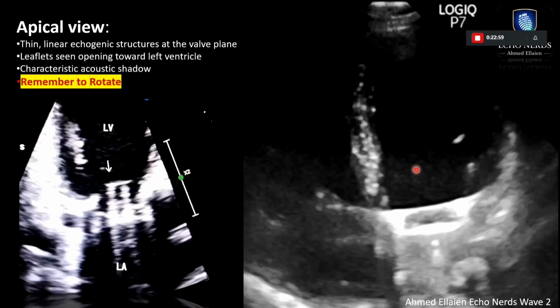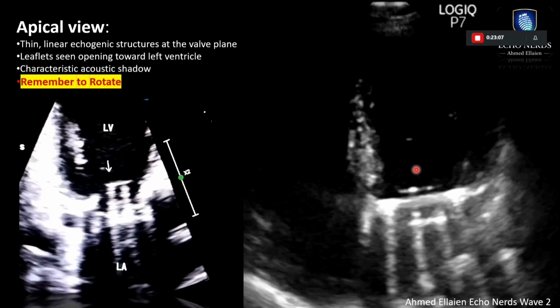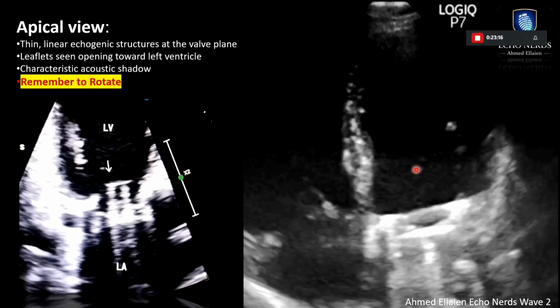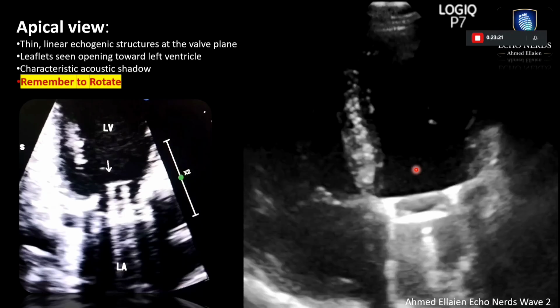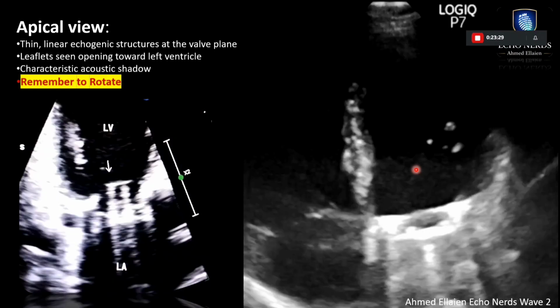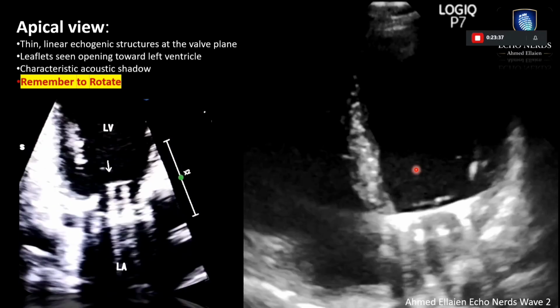So don't rush, don't say that I am seeing only one moving leaflet in the apical 4, so this valve is a dysfunctional valve. No, you have to rotate, you have to look from every possible angle, get modified views, get oblique views, until you can appreciate the two discs. If you appreciate that one disc is moving and the other is not moving in all views, even the intermediate views and the oblique views, then put the color, put the Doppler, and make your final judgment after all of these parameters are assessed.